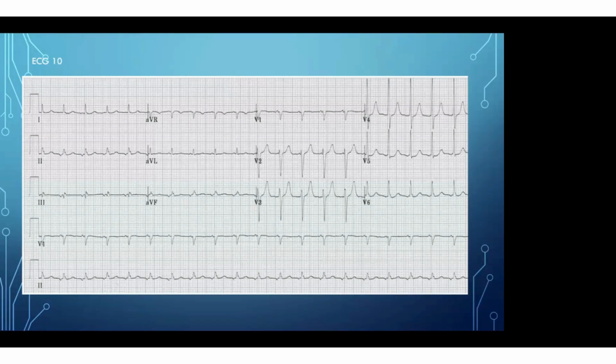Can anyone read the ECG? Is it a tachycardia? What's the relation? P wave morphology, PR, AV relation, RR interval, PR interval, QT interval, like that.